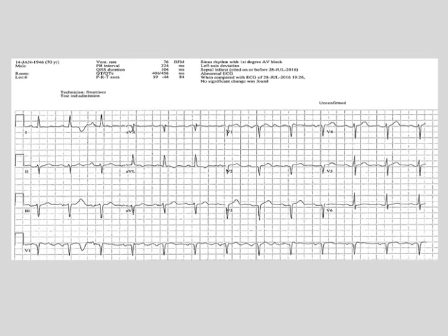Let's move on a little quicker if we can see what's going on here. Again, let's look at our usual observations and see what we can find. Well, immediately we can see this left axis deviation. Let's have a look at the P waves. They're a little tricky. There's something going on with the P waves. Now notice, this is leads 1, 2, and 3, and instead of this being lead 2, it is V1. So the P waves are biphasic or diphasic in V1.